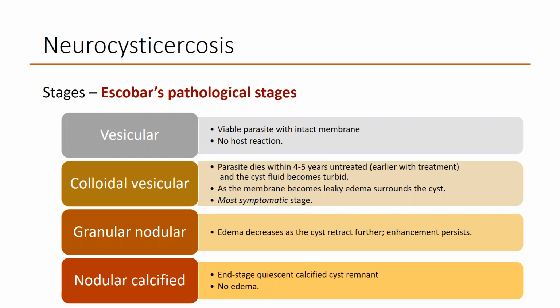In the granular nodular stage, the third stage, the edema decreases and the cyst becomes smaller. You cannot see the scolex inside. The enhancement persists to a degree. In the last stage, the nodular calcified stage, there is no edema. So in the first and last stages, vesicular and nodular calcified, there is no edema, and the size of the lesion is small. In the colloidal vesicular and granular nodular stages, patients usually present with seizures, or headache and raised ICP signs.